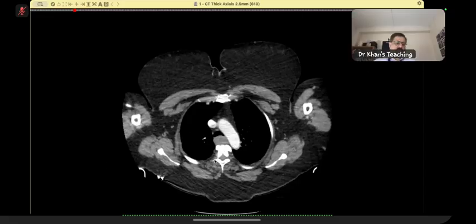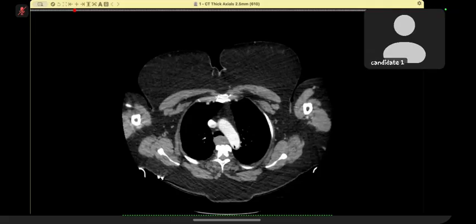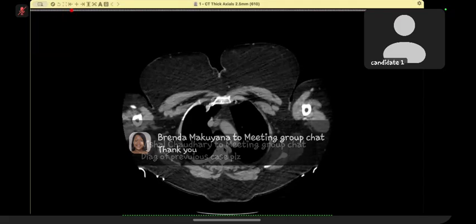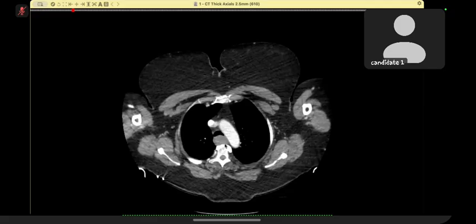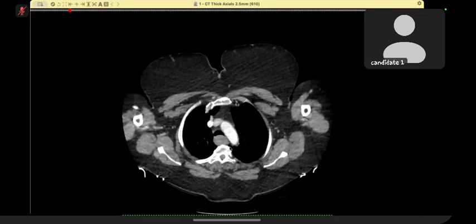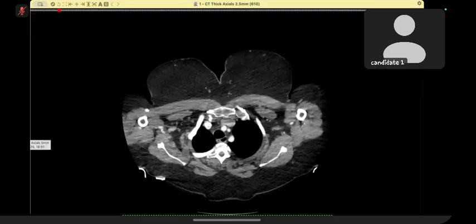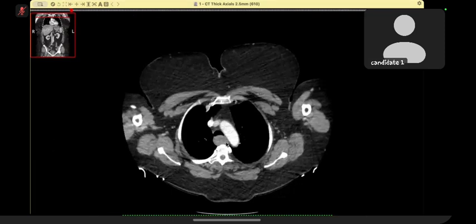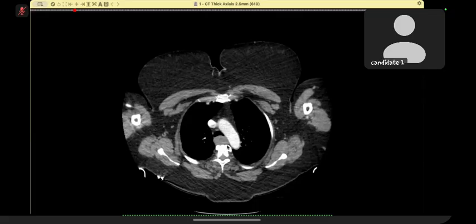How will the sagittal section help you? I just want to confirm whether this is a solitary, well-defined mass which is within the lumen, or whether it's more like an eccentric thickening which has completely occluded the lumen. On the axial plane, it looks like a solid mass rather than circumferential thickening.